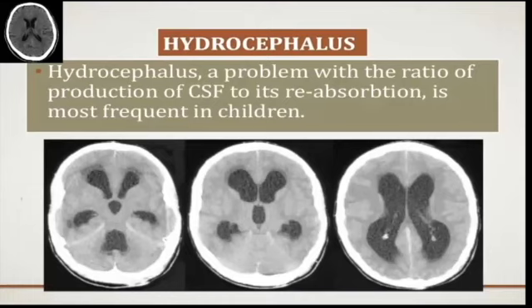What you need to do now is just observe how widened the ventricles are. Now, this wasn't on the original slide, so I just added it so you can appreciate the normal size of the normal ventricles. Now look at these ventricles. This is not normal. They shouldn't be this widened, okay? So if you see very wide ventricles and they're filled with darkness, it means that they're filled with CSF. Then you should suspect this patient has a problem, whether they're producing CSF excessively or they are unable to reabsorb CSF efficiently, okay?